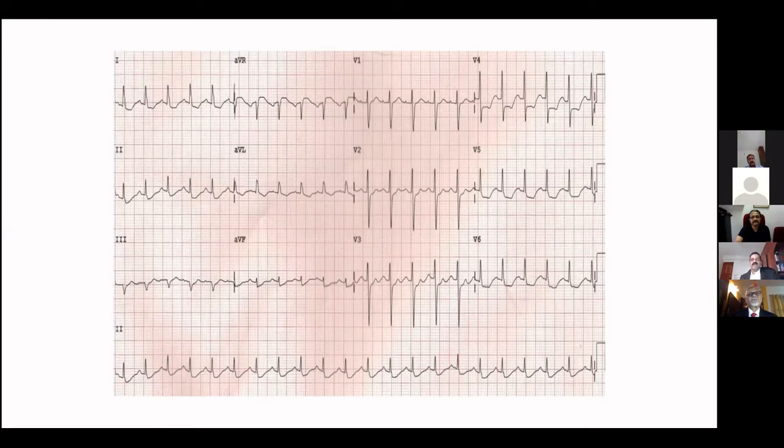So this way we can localize what the arteries are. So the ECG, apart from what we typically know, can have different manifestations which give more information than just diagnosing that there is ischemic heart disease.